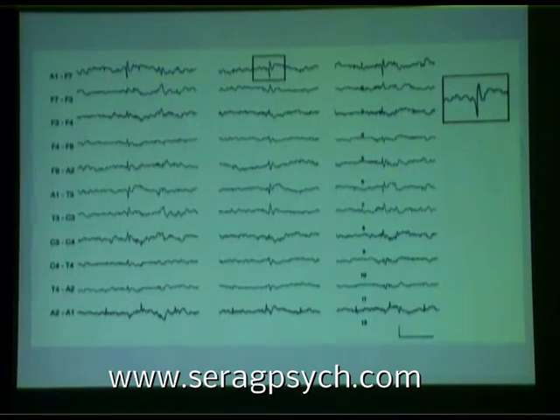If you're not sure, call it one thing, either anterior temporal spikes or small sharp. Don't try to guess on those things. But these can be quite abundant, exclusively in sleep, and they have a widespread field. This is about the most characteristic right here. You wouldn't see that on an anterior temporal spike.